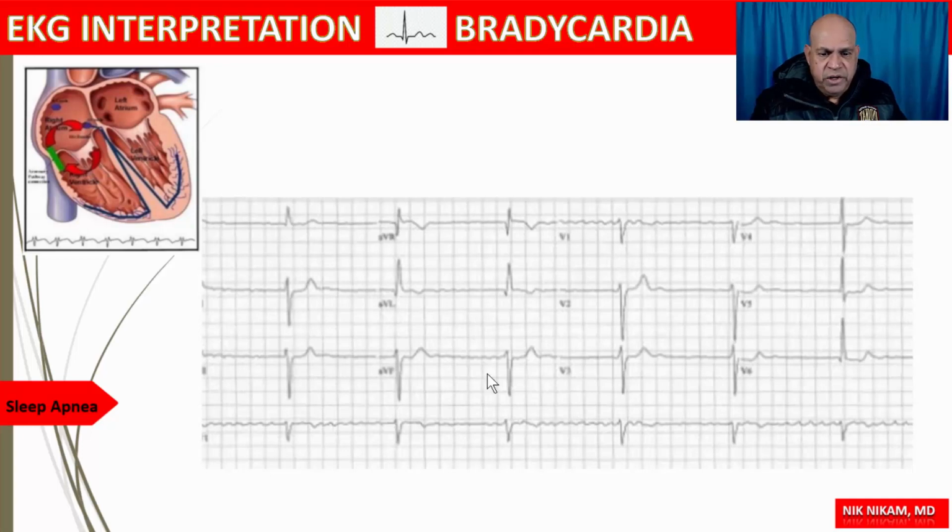If the patient is on digoxin, you can almost think that this is related to digitalis toxicity. So we are dealing with atrial fibrillation with junctional escape rhythm. That means we not only have a disease involving the sinus node, we also have a disease involving the atria, along with the disease involving the AV node and perhaps the conduction system also.